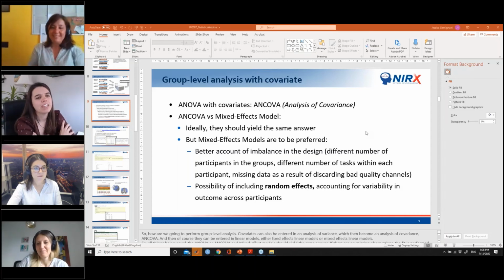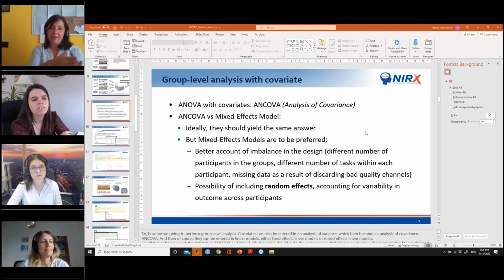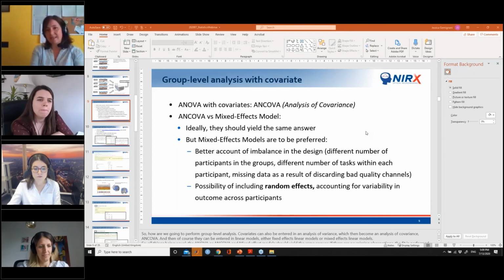So the thing is, the dummy coding needs to be done because originally the model is a regression model, so it tries to treat every single factor that you enter as a continuous variable. But of course, in this case, we had condition A and condition B, it's going to be a 0, 1, 0, 1, 0, 1 time series. And if the model tries to treat this as a continuous variable, it may be a problem.